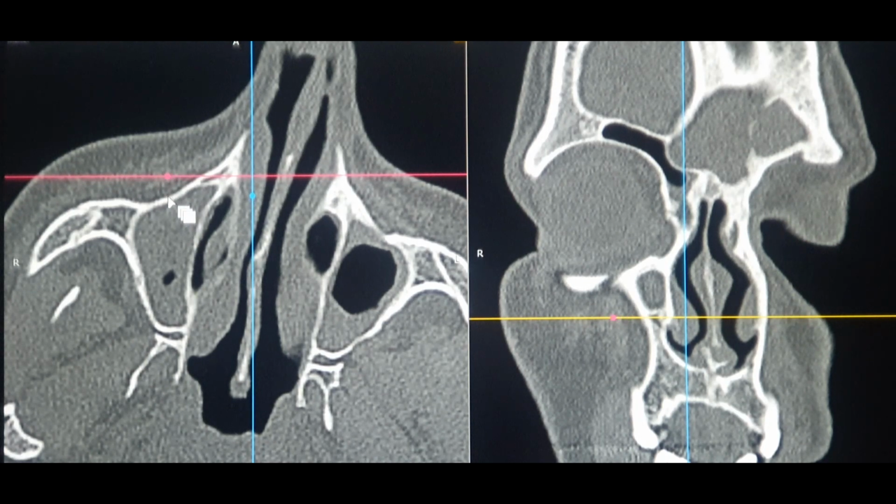up to the level of the infraorbital nerve actually. This is the patient's right side. That's the area of the wall which you remove, up to the level of the infraorbital artery, which should be somewhere over here. That's the bony margins of the maxilla. You can see that this is the inferior turbinate extending from the most anterior to posterior aspect.